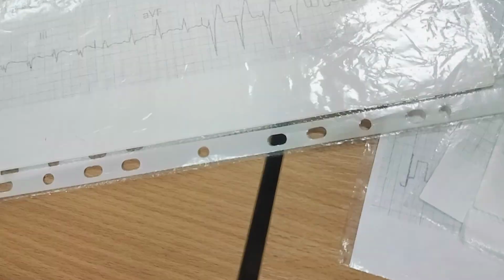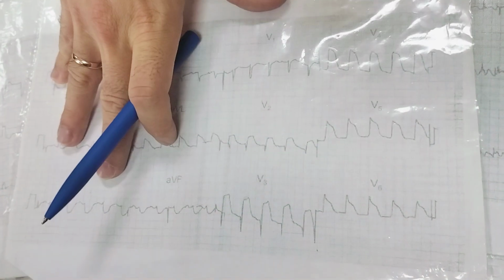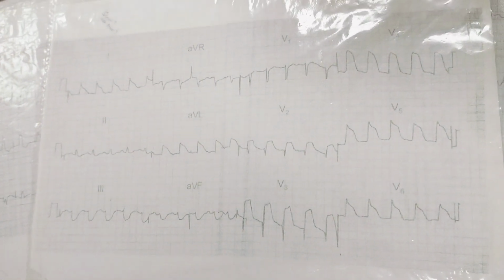Second, the periphery ECG, then you print out like this, right? These ECGs are from the Hampton book, and some ECGs are from real patients, from our hospital patients.